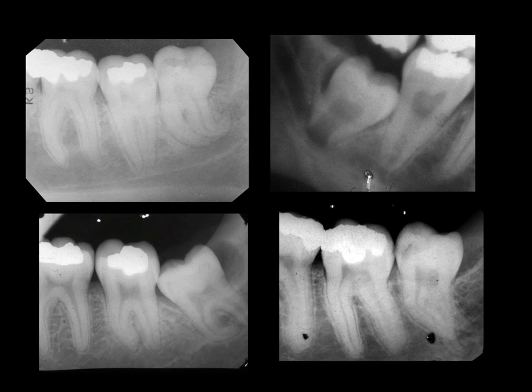We may be looking for deviation of the roots, as is seen on the top left radiograph. You can see the roots of the third molar are dilacerated or bent in a distal direction at the upper border of the canal. The radiograph on the top right shows an ID canal overlying a developing root of a third molar, and the canal doesn't smoothly go around the root, it has a fairly obvious angle at this level.